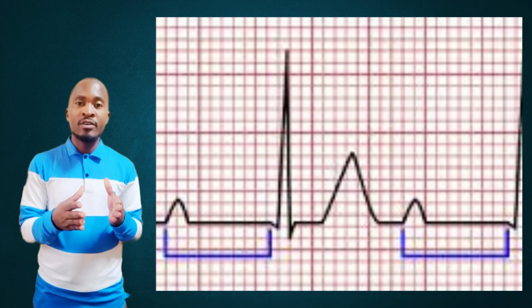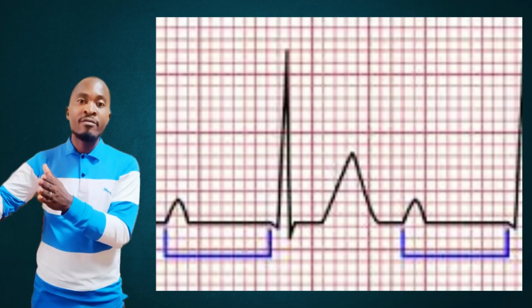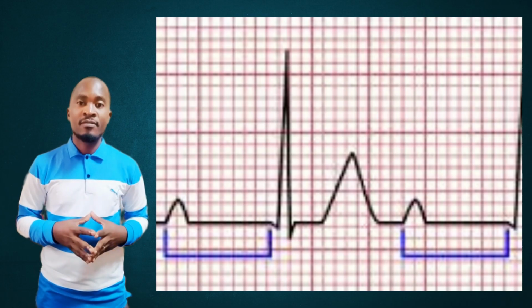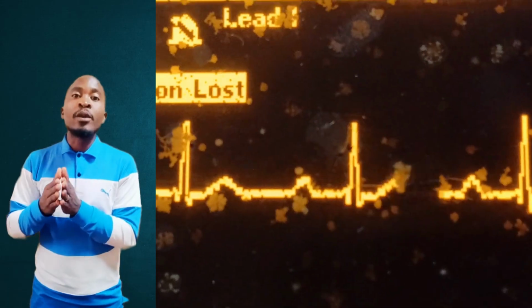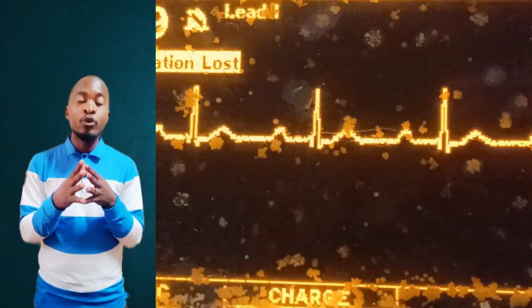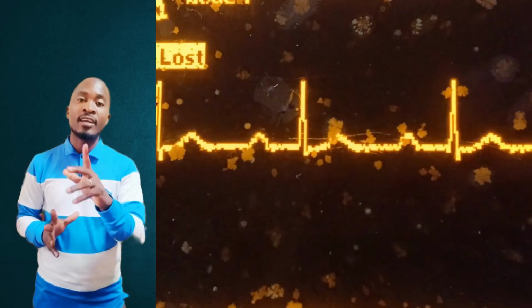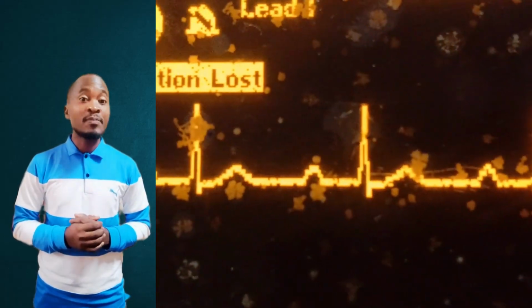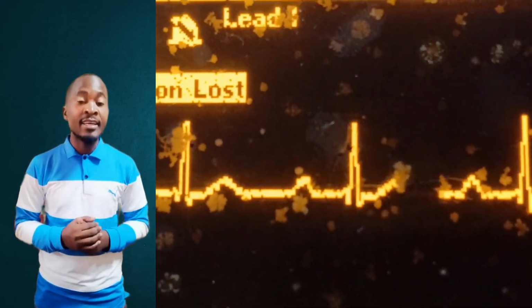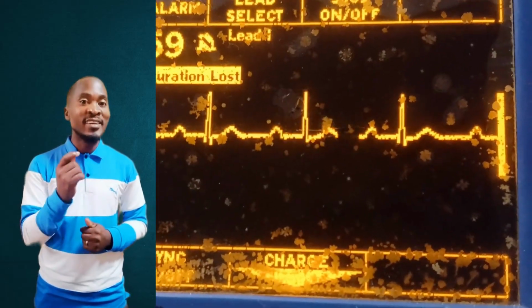In the first wave, is the PR the same as in the second wave, and the third wave, and the fourth wave, and so on? That is, analyze the subsequent PR, and if there's a problem, you pick that up. There's a secret on that we'll be discussing. Very important, especially when analyzing bradycardia. It gives you a clue of what type of bradycardia you're dealing with.